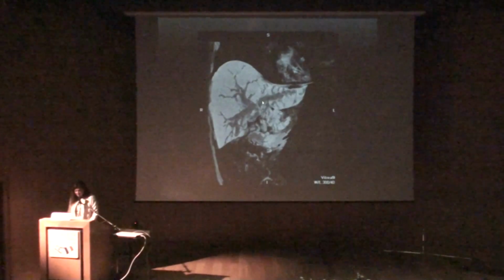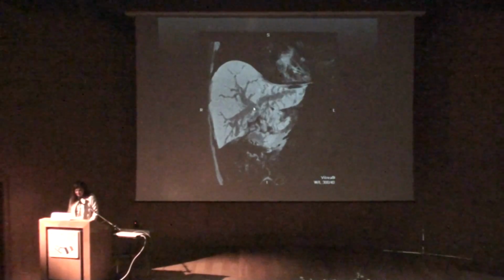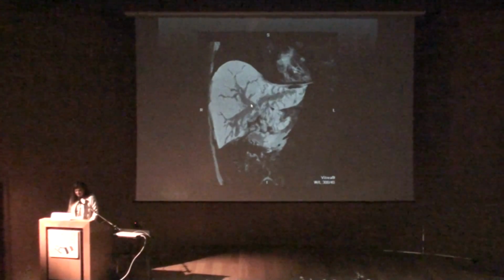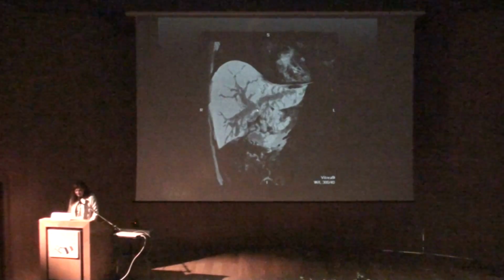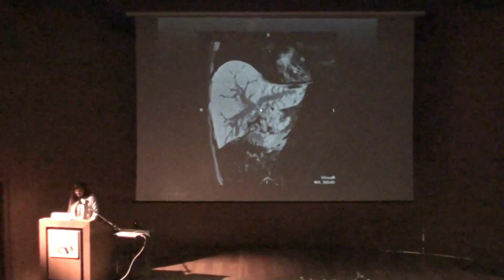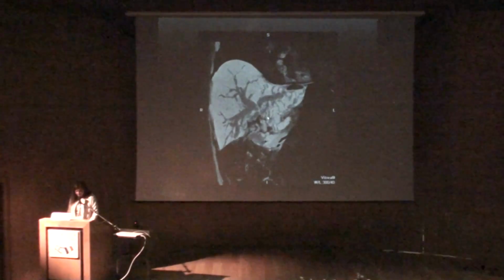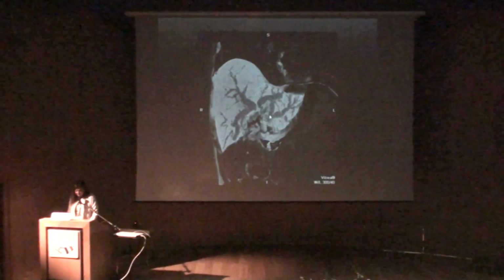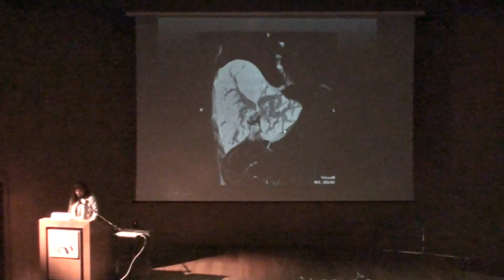There you see here the left hepatic bile duct, here the right hepatic bile duct. There is no dissociation between the anterior and posterior bile duct. And here you see the structure of the left hepatic duct, and here on the right hepatic duct. So you can conclude that probably, in this case, it's a cholangiocarcinoma type 2.